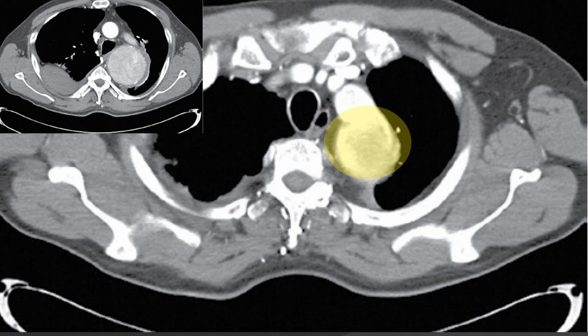The aneurysm appears to arise distal to the origin of the left subclavian artery, although I would want to review the CT scan on a workstation to confirm this finding. I would also want to find out the distal extent of the aneurysm.